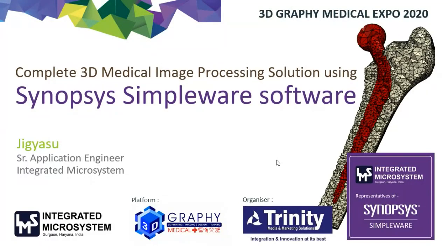For medical image processing, for converting your 2D image stacks, 2D DICOM data to be specific, from maybe MRI, CT, or all modalities of CT, MRI, to 3D models for various applications. There can be applications for simulation, 3D printing, implant design, surgical planning. A vast number of applications there can be for 3D models after you have converted them from MRI or CT images.